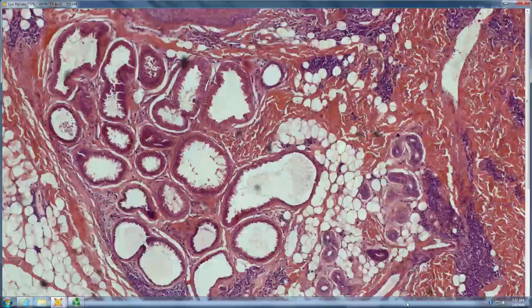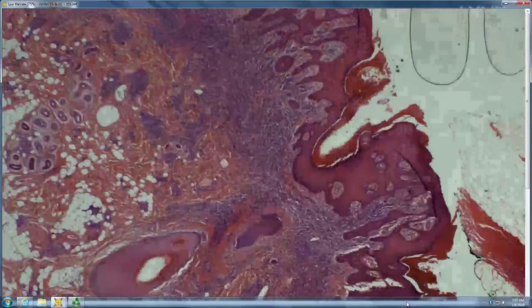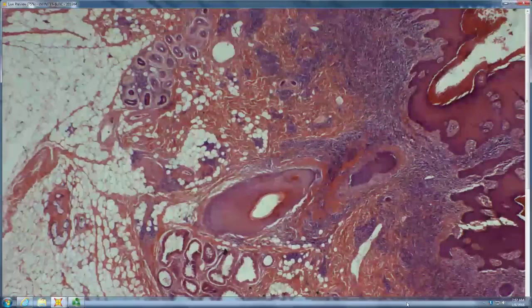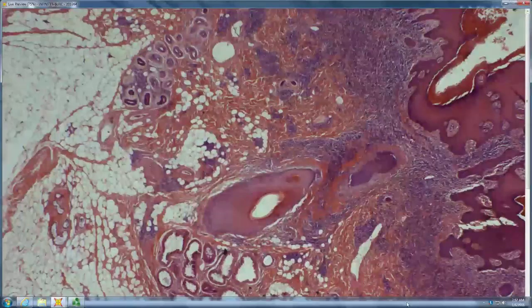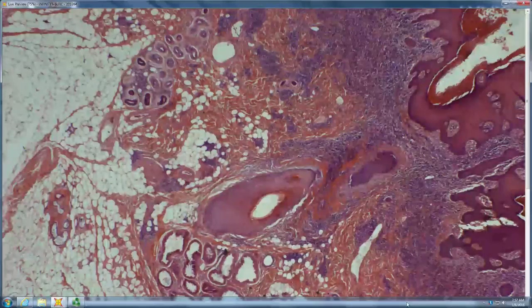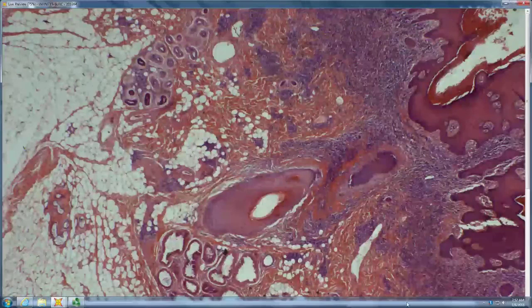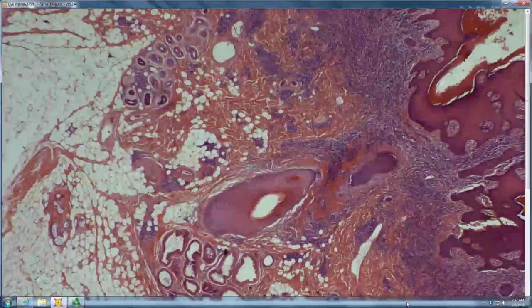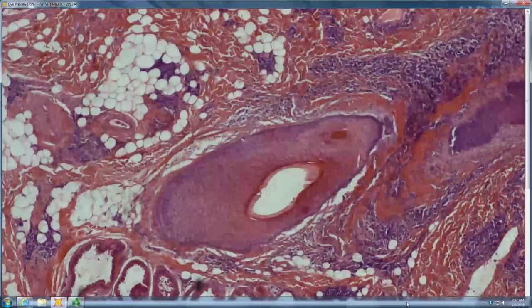Looks like a congenital nevus. First off, where do you think you are? That's scalp or breast. So there are apocrine glands. So lots of apocrine glands. What kind of areas could that put you in? Maybe axilla. So maybe axilla and anogenital also can be apocrine areas. Ear canal is another one that has lots of apocrine. That's what cerumen is, modified apocrine.